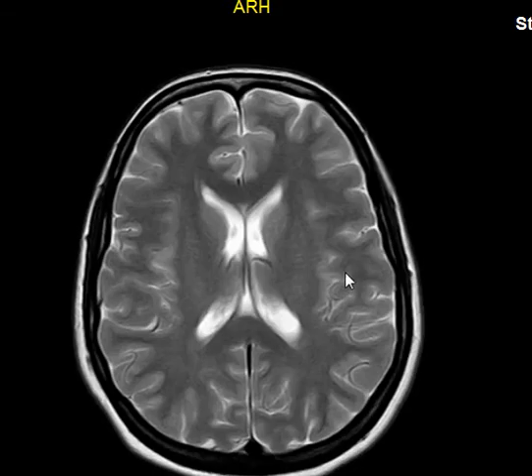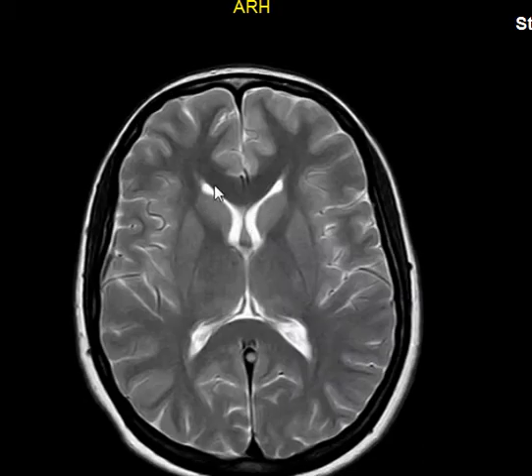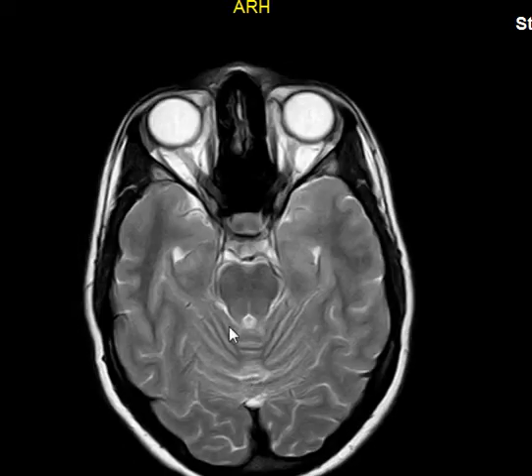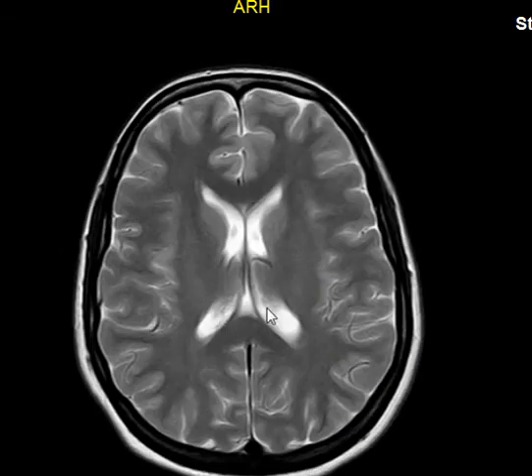So you have the ventricular system. I think we talked about it last week, which is composed of the lateral ventricle, the biggest ventricle. The lateral ventricle, right and left, is composed of a frontal horn, an occipital horn bilaterally, and a temporal horn here and here in the temporal lobes. They all meet here at the body or the atrium of the lateral ventricle.